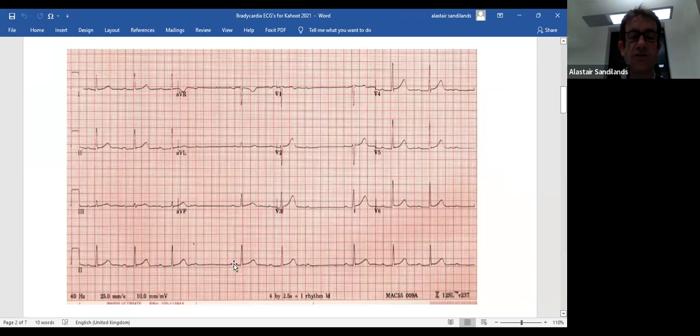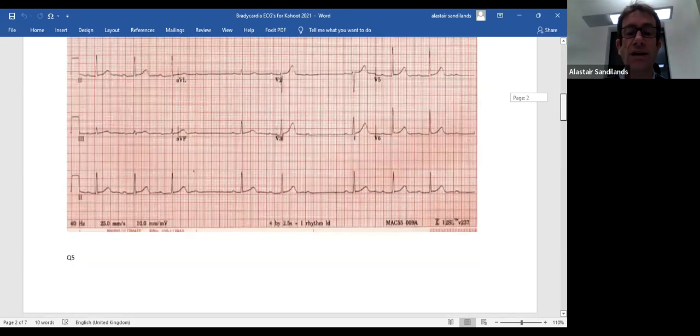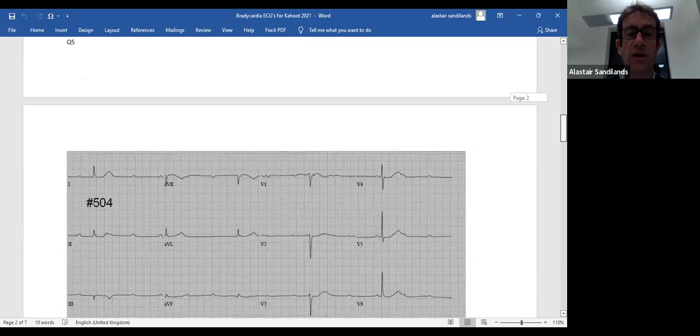It resets itself. PR interval's okay, a bit longer again. It gets stressed out a bit sooner on this one. So P, nothing. There's this prolongation of the PR interval again before it drops. So this is Wenckebach block, or we can also call it 2nd degree AV block, Mobitz type 1, so it's not so bad.